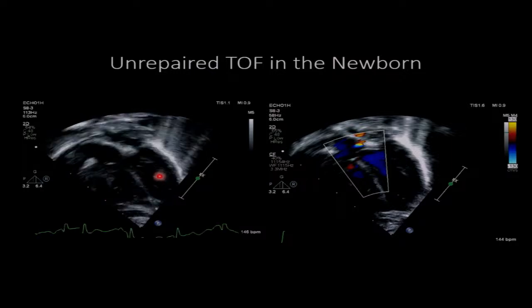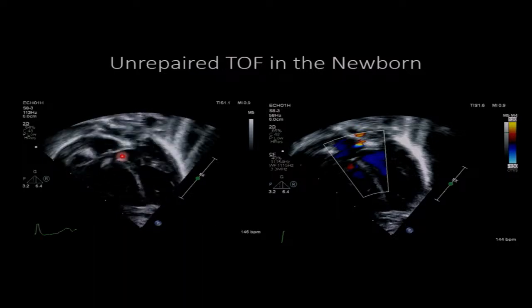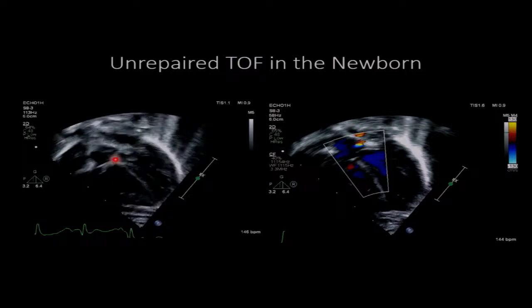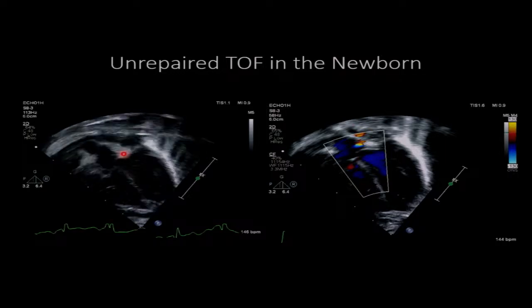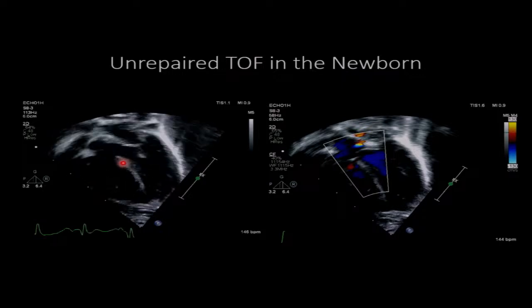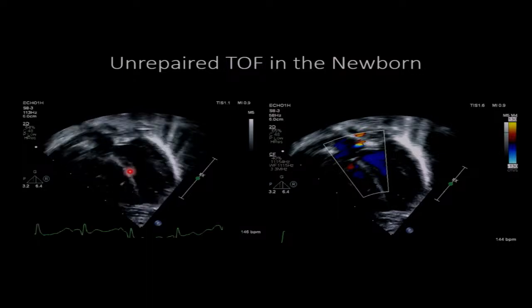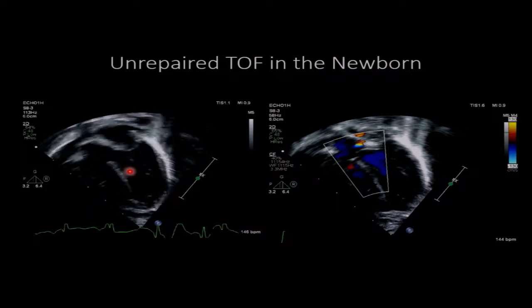So which ventricle is this? Left ventricle, yes. What is this right here? This is the LVOT, thank you. What is this right here? The aortic valve, and right below it? VSD. This is the interventricular septum, and this is the crest. What do you think about the relationship of the crest of the septum and the aortic valve in the aorta? 50% overriding. Yes, so you see an overriding aorta.